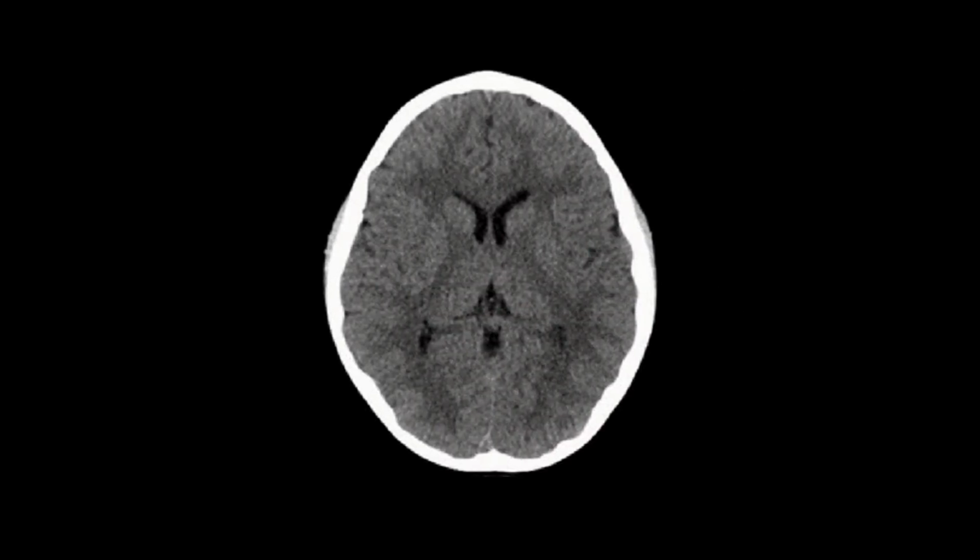Okay, so speaking of subcortical white matter, we're going to talk about two important white matter structures. One is the internal capsule and two is the corpus callosum. Think of the internal capsule as a highway which relays information from the rest of the body to the cerebral cortex and back.